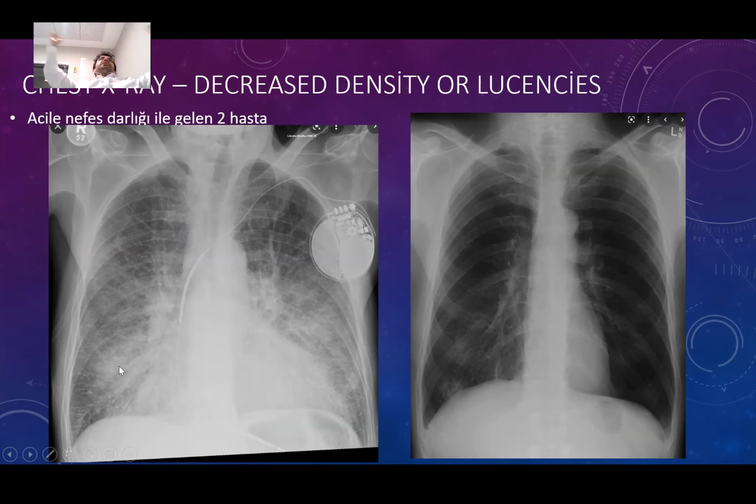So my findings are on both sides. So I'm seeing something symmetrical. It's more likely to be systemic. And gathering up these findings, putting them next to each other all together, this patient is a definite, almost definite, most typical case of heart failure. Heart failure, right? So this is what a basic heart failure looks like.